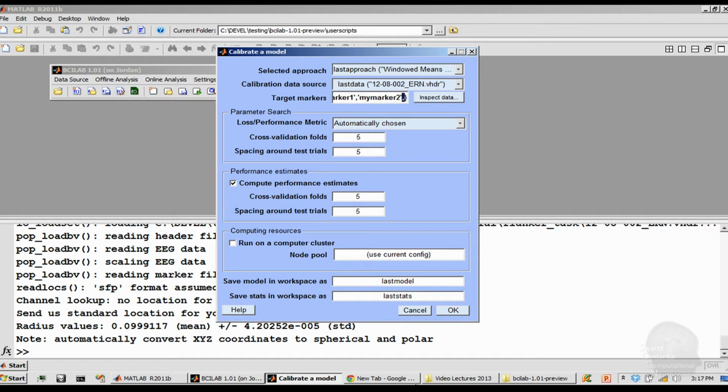And if I have more classes, I would go on and essentially say which are the relevant markers. And now if I had multiple markers that were basically class 2 or user condition 2 or something like that, I would put them in a group. And this is done with these curly brackets. So I say my marker 2A, for example, and my marker 2B.